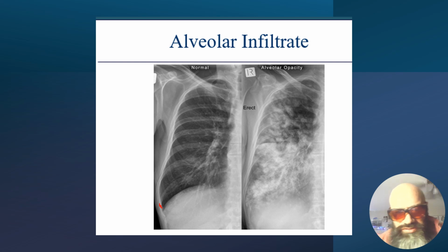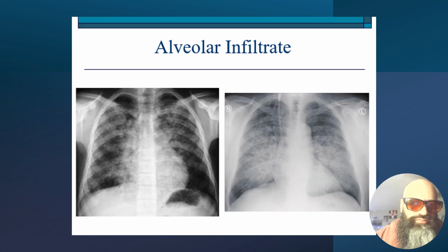So this is a good example here of localized alveolar infiltrates. They have this round pattern here. Now this is clearly taking up a lot of the lung field. The loss of the costophrenic angle here, loss of the border between the right hemidiaphragm and the previous air density within the lungs. So these alveoli are filled with fluid, and they are causing significant compromise to the patient's ability to breathe and conduct oxygen dissociation into our soft tissue structures.